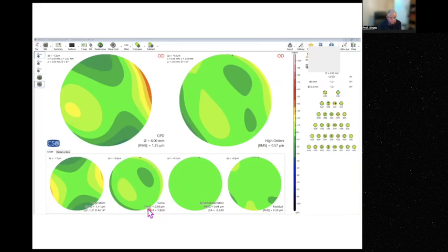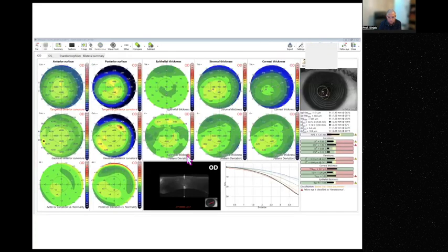The coma is 0.49, but because this is Cyrus or MS39 CSO, up to 0.5 is normal. Here, the RMS altogether is just above 0.5. So some coma effect. This is coma effect. And the diagnosis of the machine shows borderline in the right eye.